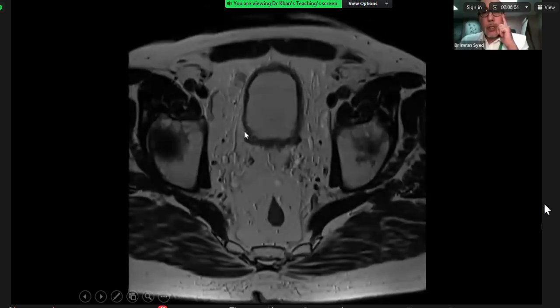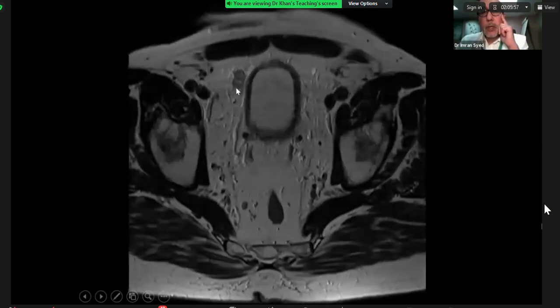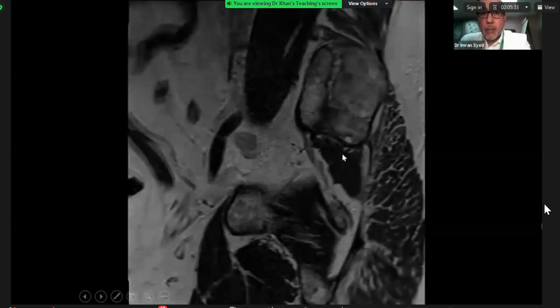Well, this is in the context of a trabeculated bladder, and that's not surprising given the prostate size. And also additional to that, you've got this perivesical tumoral nodule. Now, the difficulty here is this is not typical for a lymph node to be located, because the lymph node locations, as we said, were peripheral, side wall, obturator, presacral, and iliac. But if you do get something here, this could be either a tumour nodule itself or indeed a lymph node. So it's worth bearing that in mind.